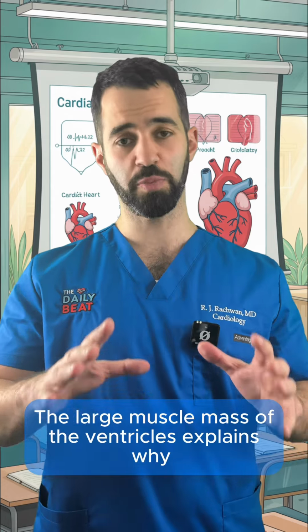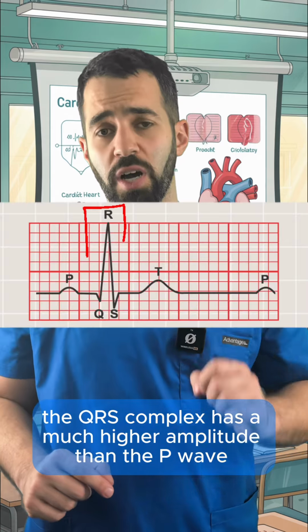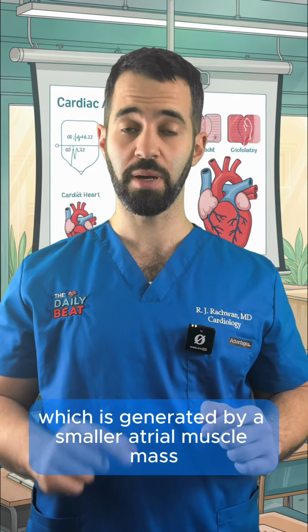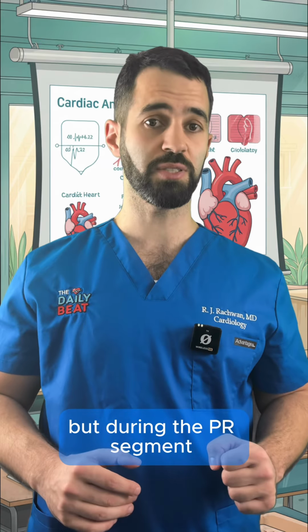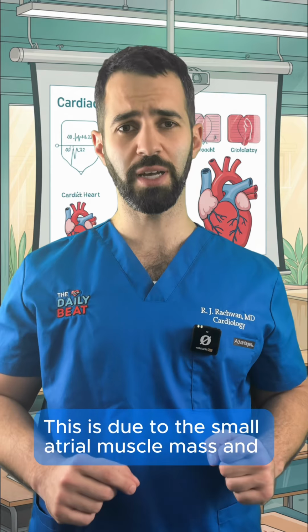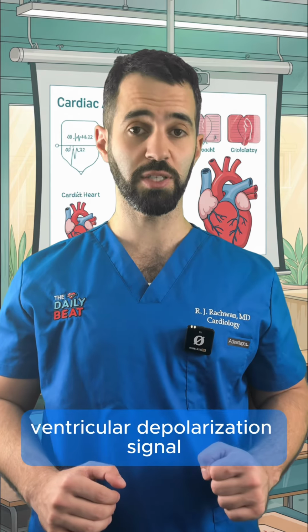Interesting fact: the large muscle mass of the ventricles explains why the QRS complex has a much higher amplitude than the P wave, which is generated by a smaller atrial muscle mass. Also, atrial repolarization occurs during the PR segment, but it's not visible on the surface ECG. This is due to the small atrial muscle mass and overlap with the much larger ventricular depolarization signal.